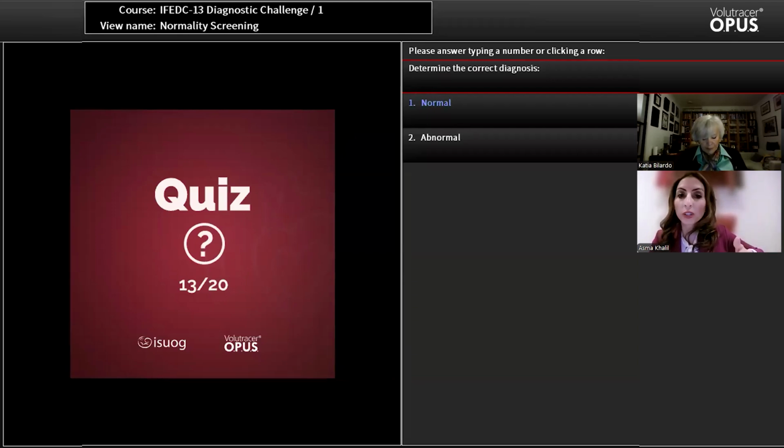Your responses: more than 90% of you knew that it was abnormal, and that's not an easy diagnosis, but you got it right. So fantastic, you're really definitely experts here. And more than half of you got the diagnosis right, that it's a VSD, a ventricular septal defect, even without the color Doppler. So that's very good.